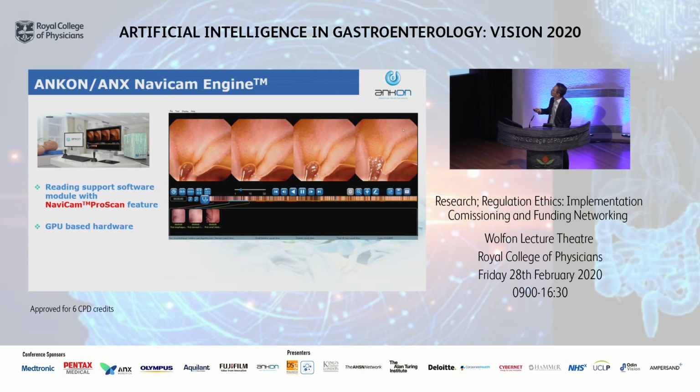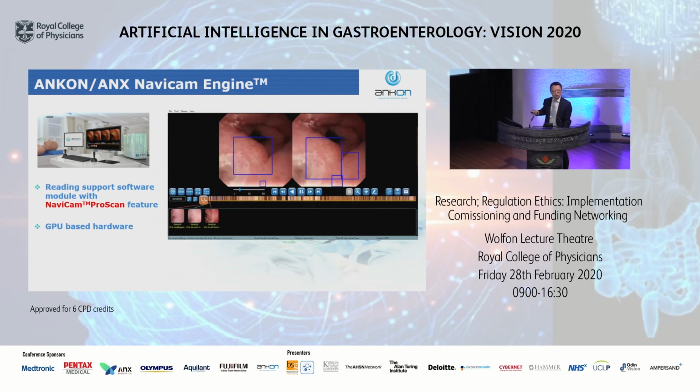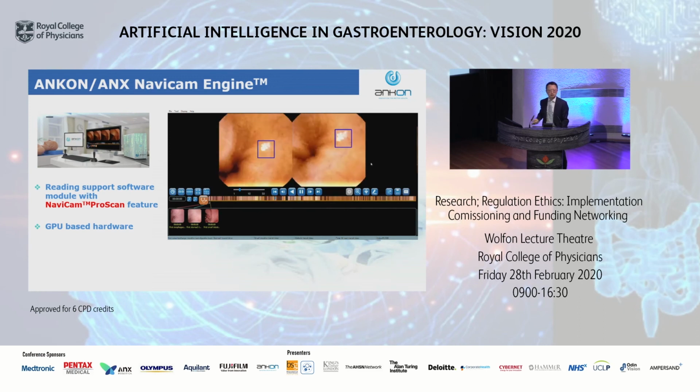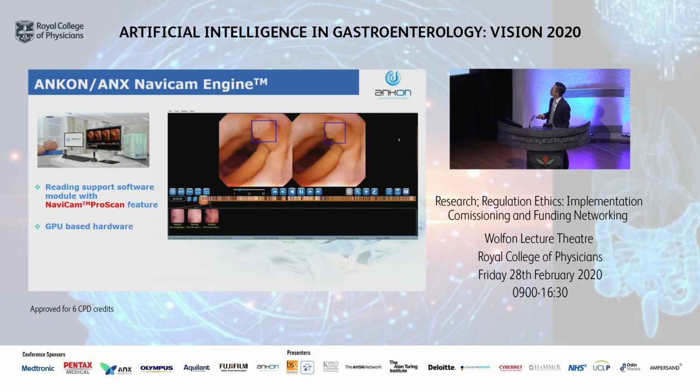If we click that, it quickly screens out all the positive lesions and reduces the images substantially. Then this data is presented to the doctor to decide whether it's true positive or not. That's very handy to use.